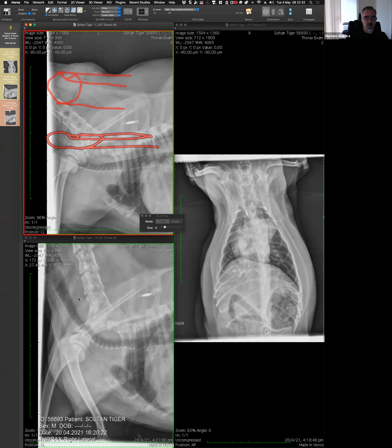So I'm trying to explain how I would react to that comment, and I would probably say that I think the diameter of the trachea, this is the larynx, and if you continue that into the trachea, it seems to be similar, and here is similar. So I think this is the membrane, probably clinically irrelevant.